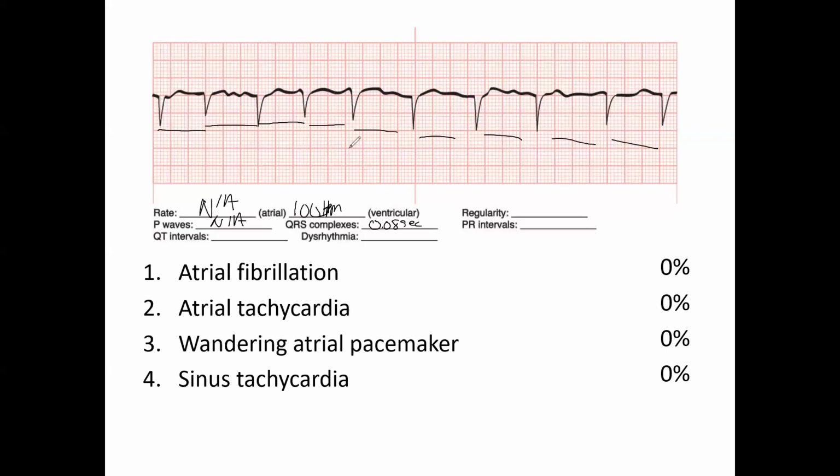The regularity, it's not occurring regular, so I'm going to say this is irregular. Your PR intervals, you can't find the P intervals.